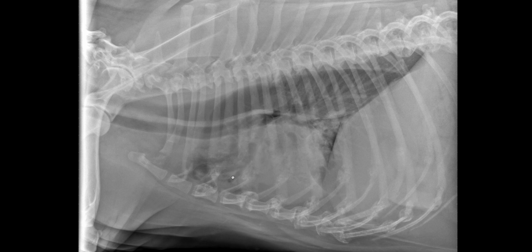And then we can see the air bronchograms, which are those radiolucent tubes, which are the bronchi filled with air normally, but we see them better because all the alveoli surrounding the bronchi are filled with fluid most of the time in the alveolar pattern.